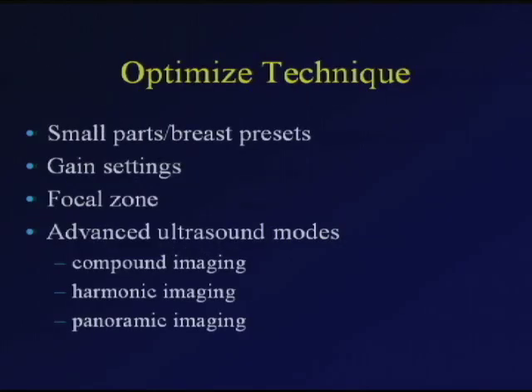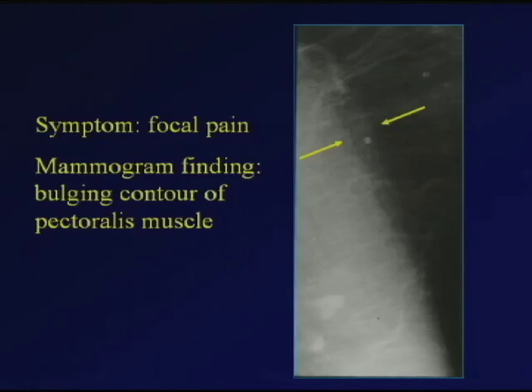Remember to make sure that your presets are on your breast settings, watch gain settings, make sure the focal zone is in the region where you believe the mass to be. And you might want to try using some of the advanced ultrasound modes, compound imaging, harmonic imaging, or panoramic imaging to view a large area of the breast.